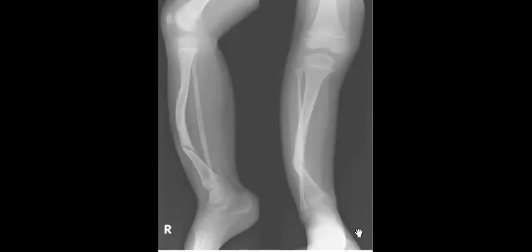Neurofibromatosis, yeah, first. And you will search for any criteria like fibular hypoplasia and multiple pathological bone fractures, pseudoarthrosis, as we mentioned, and if you look for other abnormalities, like ribs will be ribbon ribs, posterior vertebral scalloping, sphenoid wing hypoplasia.